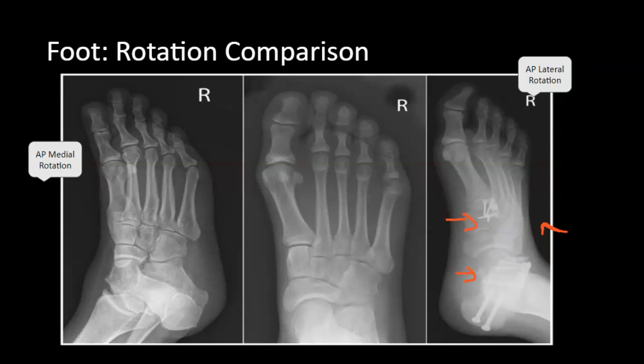Now, with medial rotation, the metatarsal bases demonstrate decreased superimposition. The medial and intermediate cuneiform joint space here is still demonstrated as closed. And the talus, as you can see, starts to move away from the calcaneus, resulting in less than one third of the talus superimposing the calcaneus.